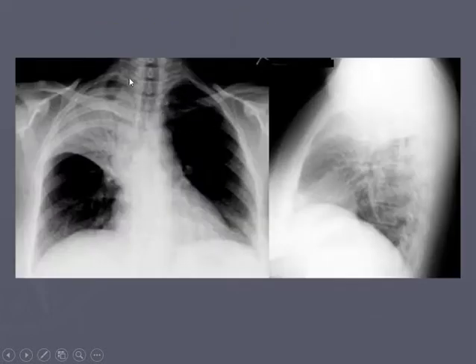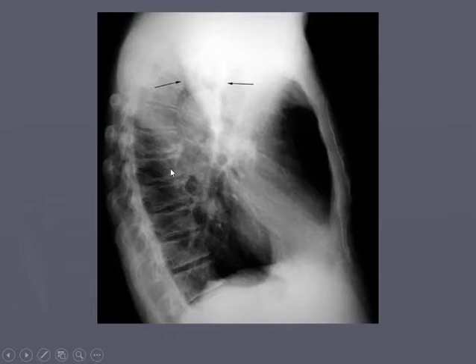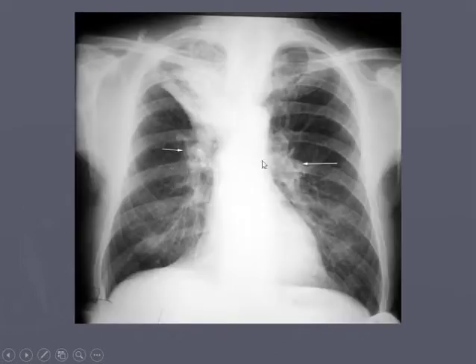Okay, B, bones, 1, 2, 3, 4, 5, 6, 7, 8. I'm seeing like 8 or 9 ribs, which is fine, so that means they inhaled. Cardiac shadow here, okay, and then our pulmonary arteries. So I got a pulmonary artery here and a pulmonary artery there. We have our nice 20-degree angle, where on that previous one, we did not. In fact, this was pulled up. Again, because that atelectatic tissue was all smushed, the lungs had to inflate and fill that space.